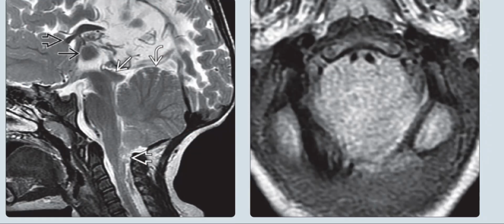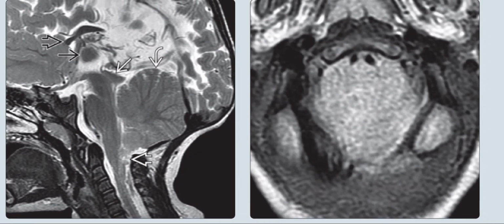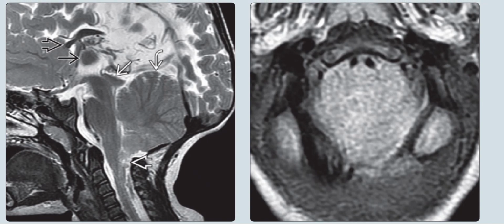In these images, we can see that the left image is the sagittal T2 weighted MRI, and it confirms the characteristic findings of Chiari-2 malformation, again including the tectal beaking, the vermian displacement through the foramen magnum, the towering cerebellum, the large massa intermedia, and the dysplastic corpus callosum. The right image is basically the axial sequence of the same T2 weighted MRI, and it shows the characteristic posterior fossa crowding at the foramen magnum, reflecting the small dimensions of the posterior fossa, combined with cerebellar ectopia and vermian displacement through the foramen magnum.